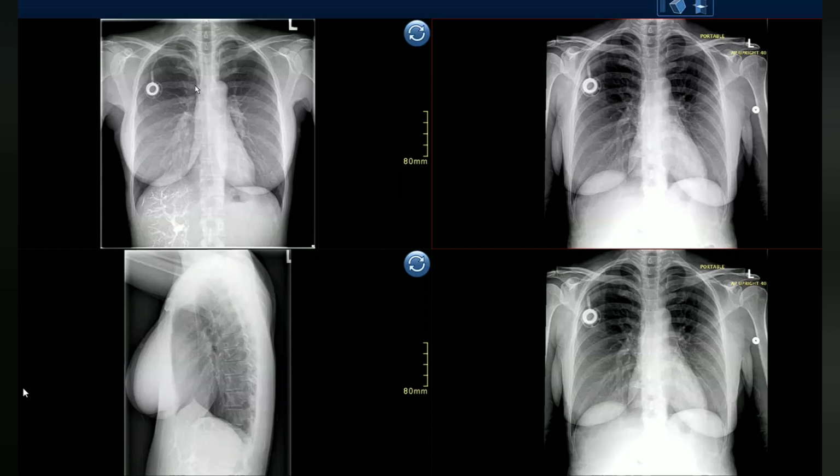No, it has a name. This is a porta cath. Why do you put a porta cath? It is put to instill chemotherapeutic agents. The patient is having any malignancy, and she is undergoing chemotherapy.